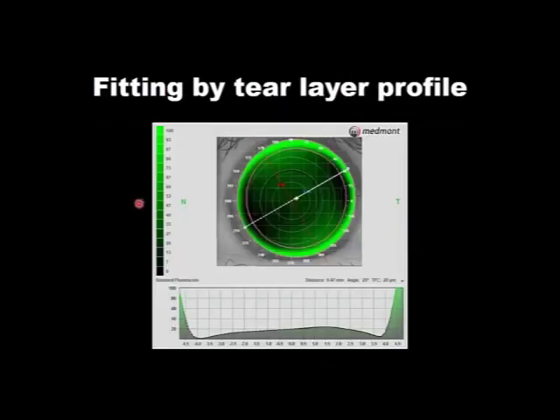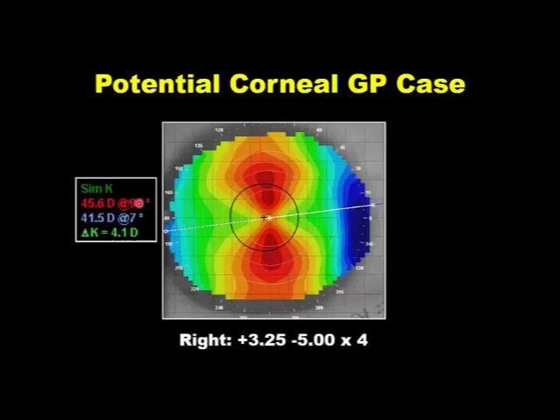Probably not. Now, as we said earlier, one of those valuable tools is the contact lens software. So we can place the lens on the surface of the eye and determine, does that pattern look acceptable? Does this lens have any hope of being successful? So let's take a particularly challenging case.